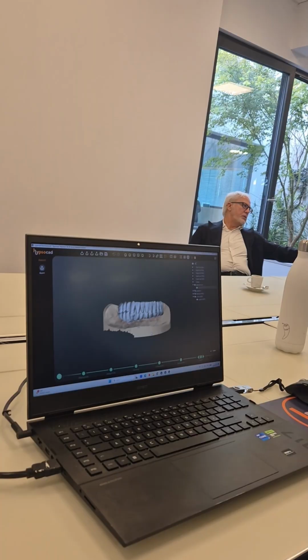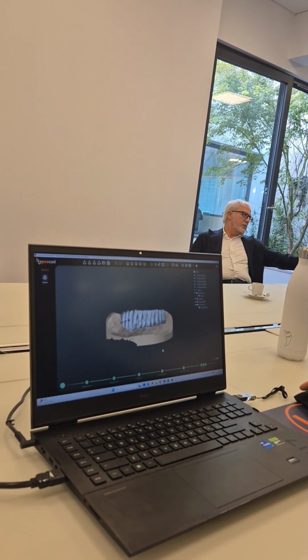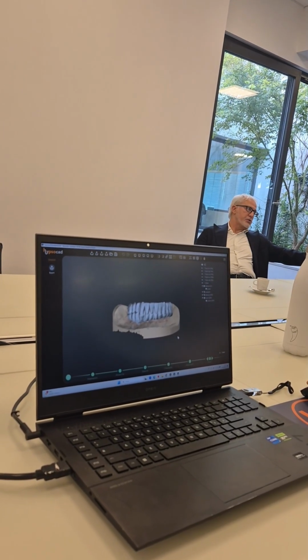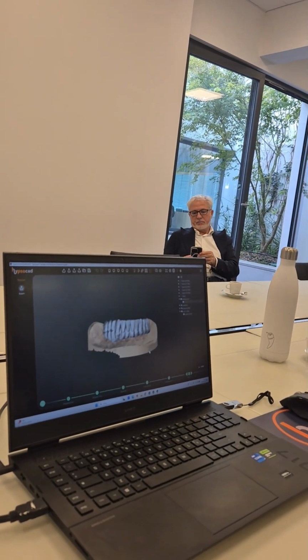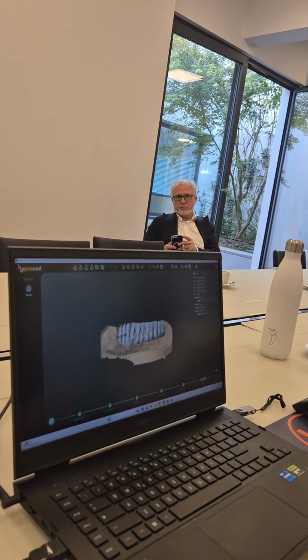At the start, when you select the patient data, there is management for the patient information there, all built in. This is the standard data, Zoltan. Without this data, you don't work for the CAD solution.